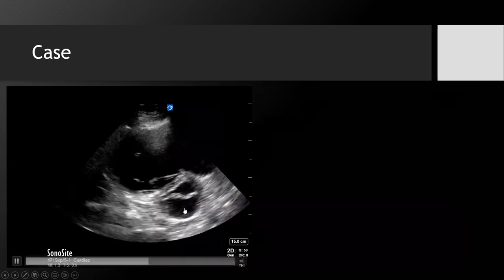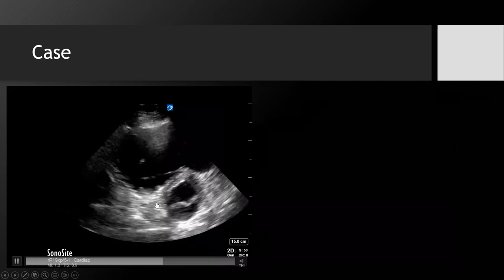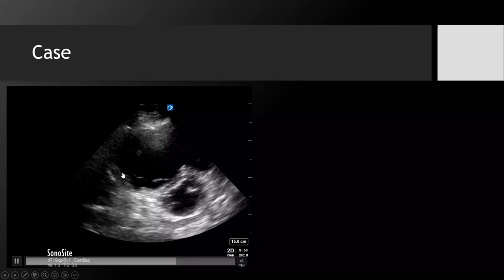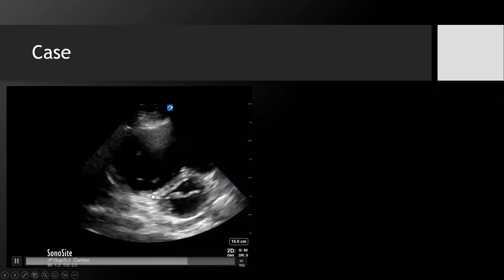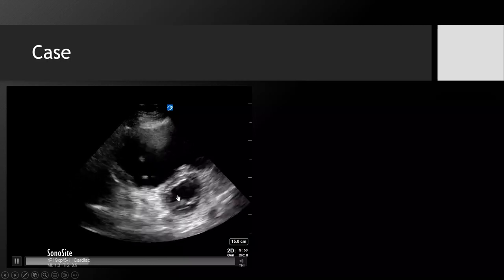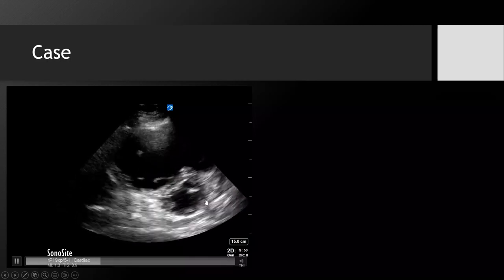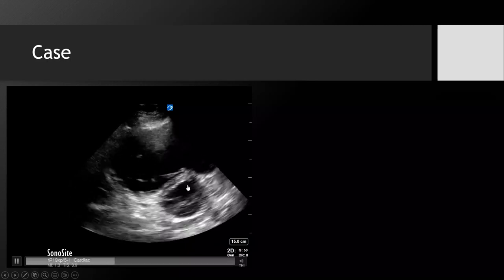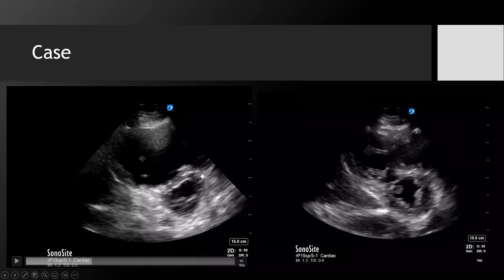And here it is. And you might think, and it's possible here, that you're on the parasternal short axis at the mitral valve level, very large RV. I don't think anyone needs to be an expert to see that. And if you look closely at this, if you pause the video, you might convince yourself that this is RV volume overload: in systole, when the RV is contracting, it's becoming a little bit more round, and as it's dilating in diastole and filling, it's becoming a little bit more flat. But that might be a little bit of a soft call.